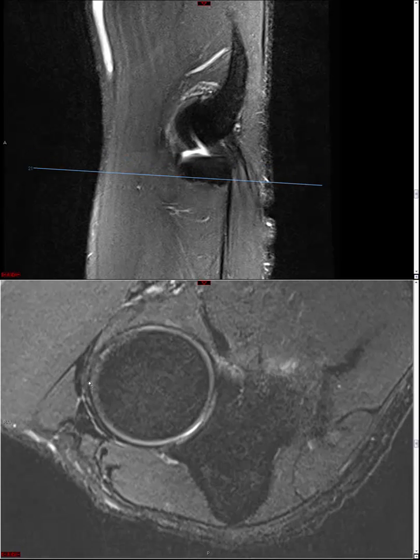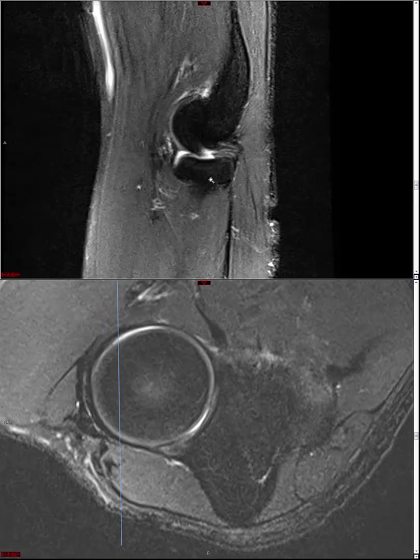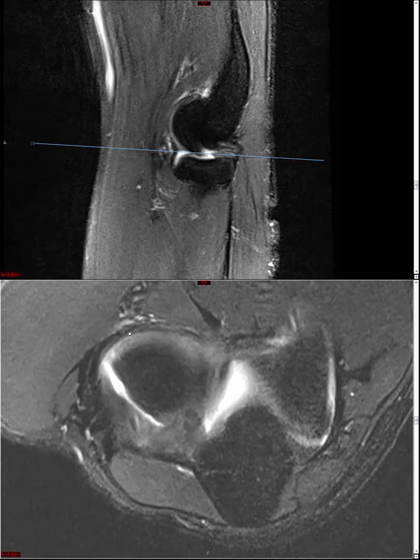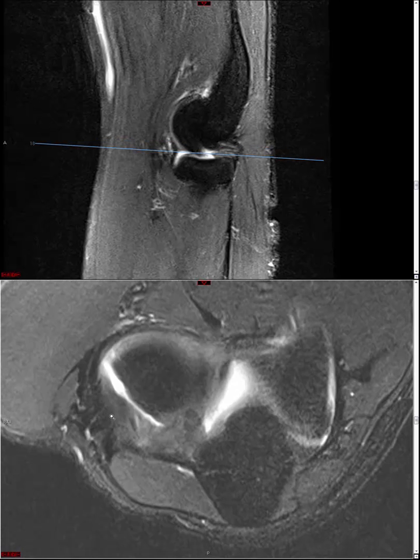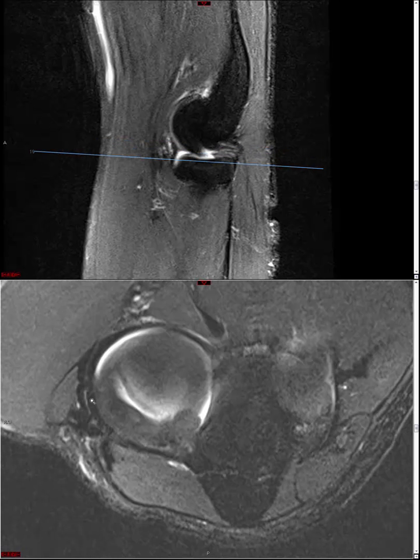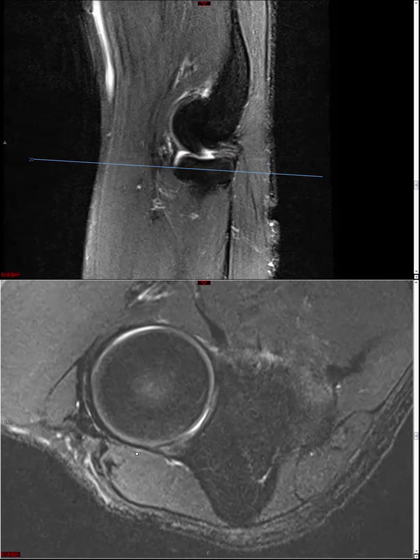So here's your radial collateral ligament inserting onto the annular ligament. I'll confess that I don't spend too much time assessing the annular ligament on a routine basis. Radial collateral ligament I do look at, and then to find the lateral ulnar collateral ligament, we just have to go back to where we expect the origin to be, just posterior to the radial collateral ligament, and we're just going to scroll slightly distally from that point, and you're going to start to see this ligamentous structure that curves around the back of the radial head and neck and inserts upon the supinator crest of the proximal ulna, and here it is. Here it's this guy right here.